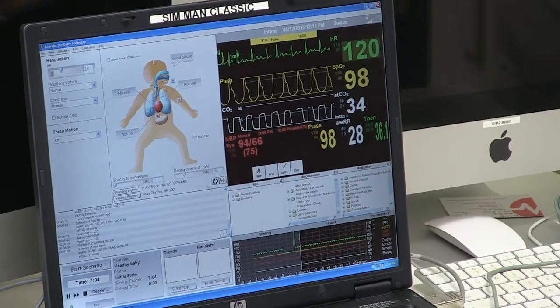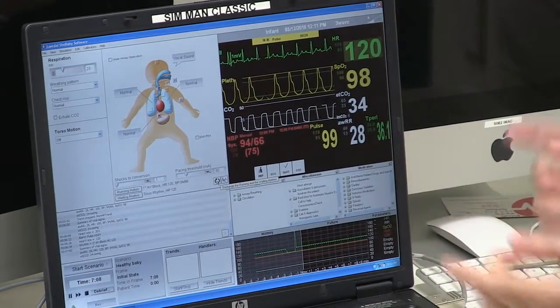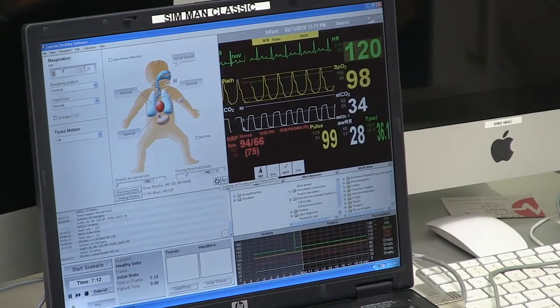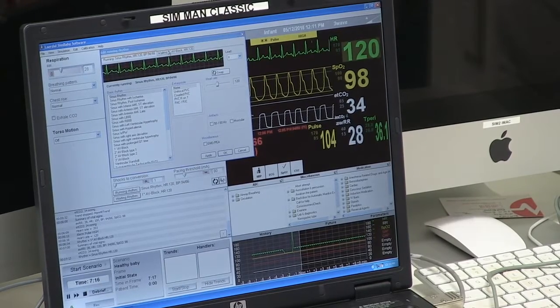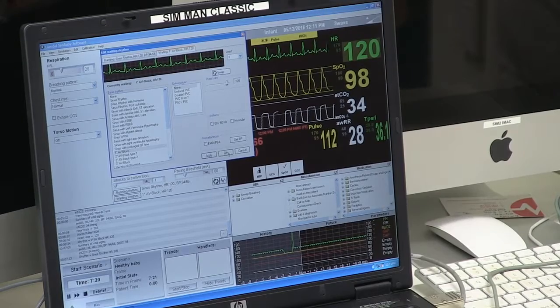You can see this little toggle button back here. It's one arrow this way, one arrow this way. That'll help you go back and forth between rhythms. You can also click this one and click on waiting rhythm, apply, and OK that way as well.